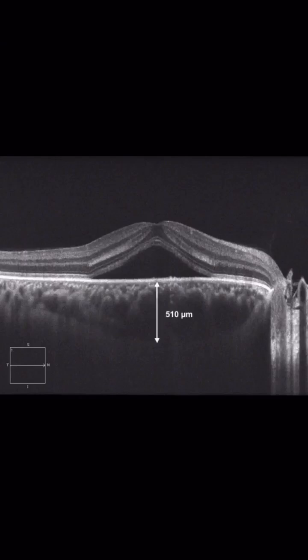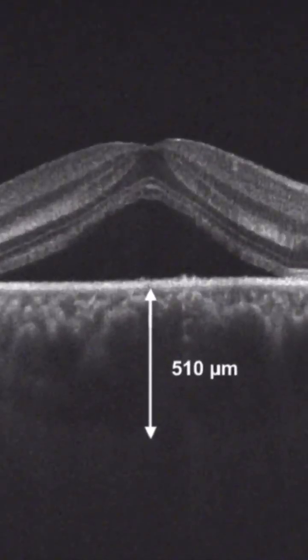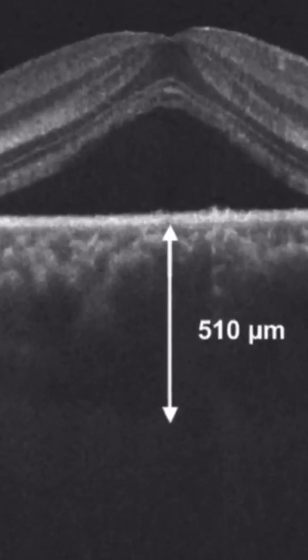And the last case is when the choroid is too thick. Not every scan can pick up this. You usually need an EDI OCT to go deep enough, or a swept source OCT that can capture the choroid. You can see the end of the choroid, which is right here, and you can see that the choroid is pretty thick in that case.